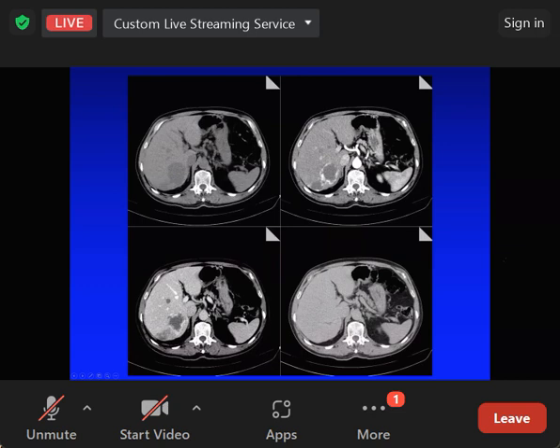So here we've got a hemangioma over time with a contrast enhanced scan. Top left, we've got pre-contrast where you can see this low attenuation lesion in the right lobe of the liver. Top right, you can see this is the arterial phase because we've got contrast in the aorta, contrast in the celiac trunk, and here you're getting this slow peripheral nodular enhancement.